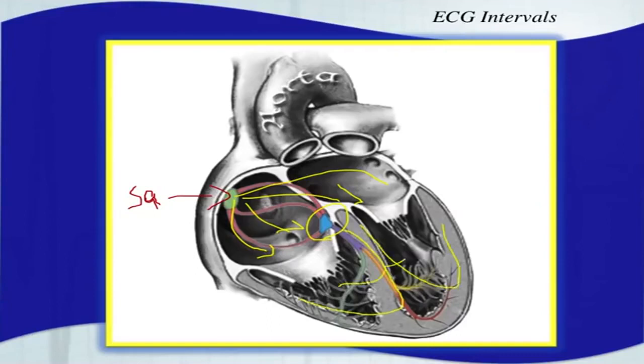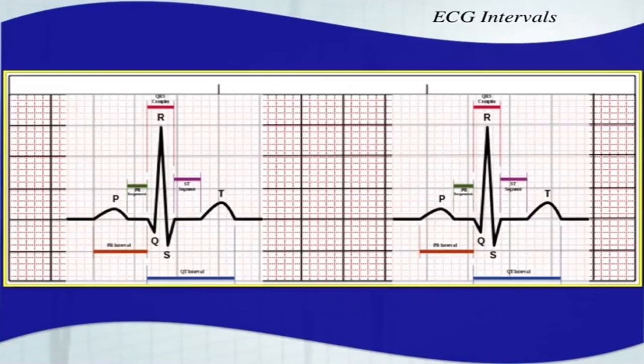Following that, after ventricular depolarization, you get ventricular repolarization. And there is a slight pause in between those two things, or there may or may not be, depending on the type of ECG rhythm you're looking at.